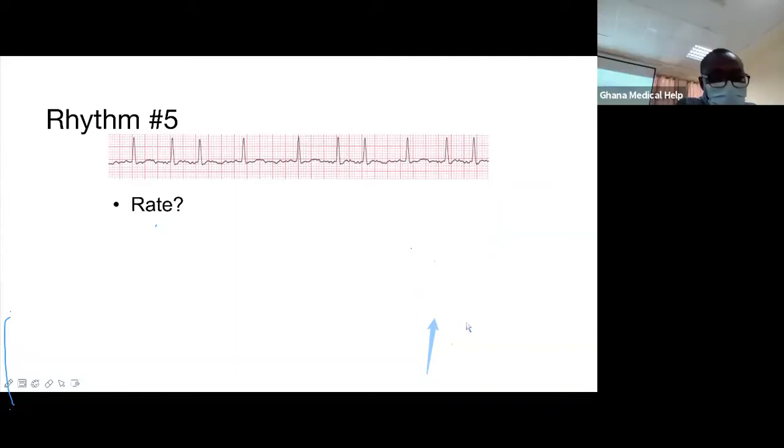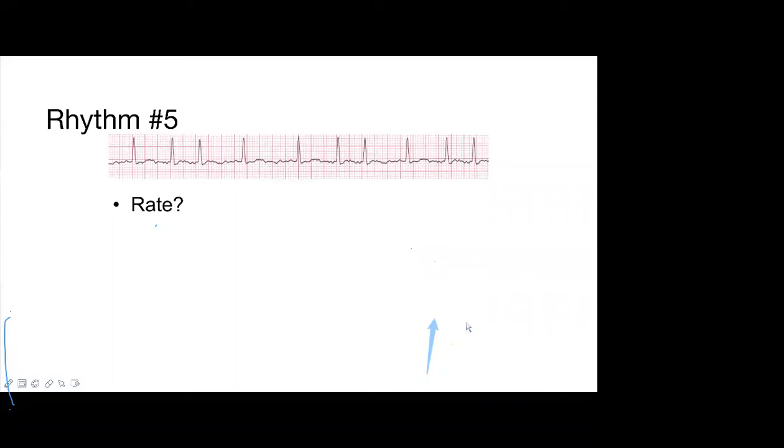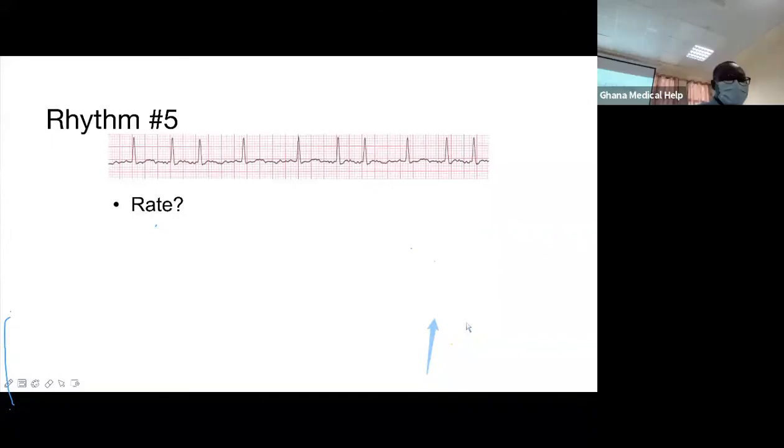Okay, 300 divided by... Great. So the thing to always look out for, like I initially mentioned, is that if you are going to use that 300 rule, if you divide 300 by, there are 1, 2, 3, grossly 3, so 300 divided by 3 will give you 100.